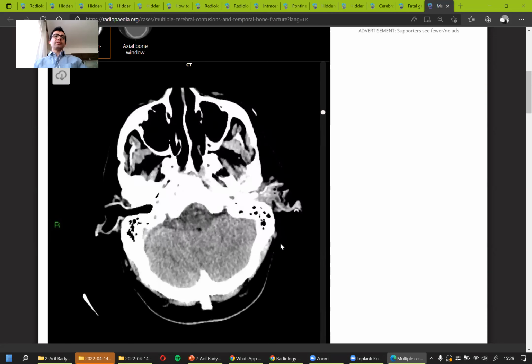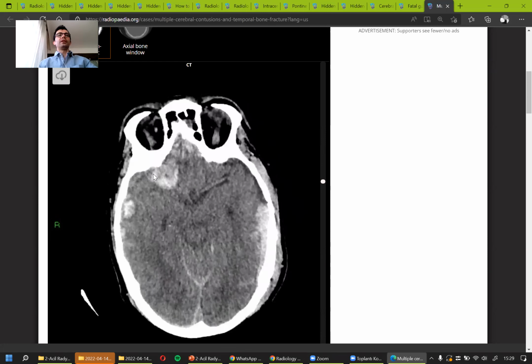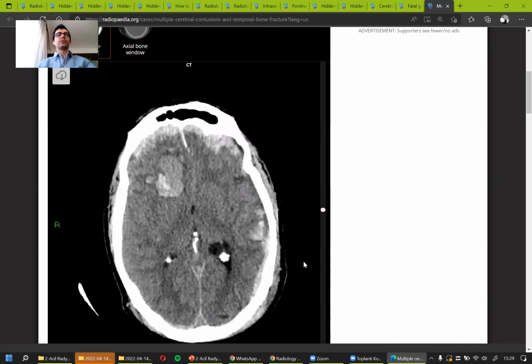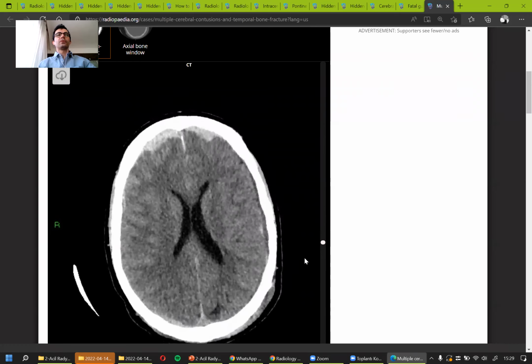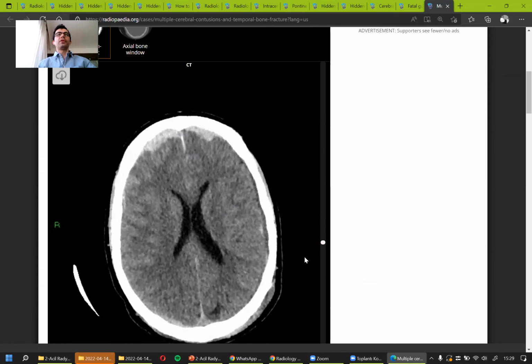I'm seeing hemorrhage areas, right, inside the parenchyma. These are all hemorrhage areas, a lot of them. I'm also seeing some type of hemorrhage which is not inside the brain actually, but covering the outer wall of the brain, right? Hocam, the ventricles are symmetrical. Ventricles are, okay, let me draw the midline.